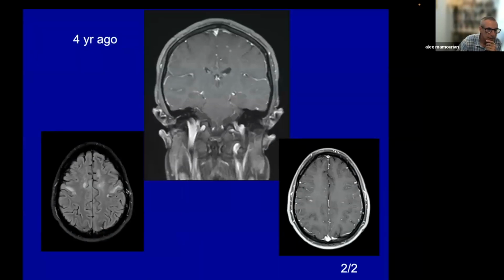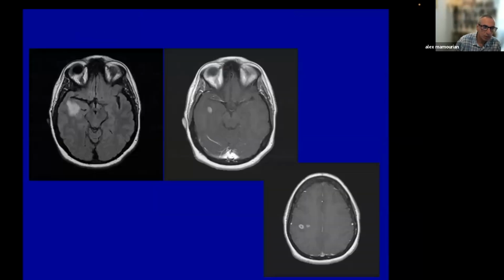And you can see, again, some of these lesions were here, but many lesions were enhancing, but not peripherally, more solid. And based on the slow progression in this case and the periodicity, the feeling was this was a variation of demyelinating disease, and testing was done for these MOG antibodies, and that's what this proved to be.